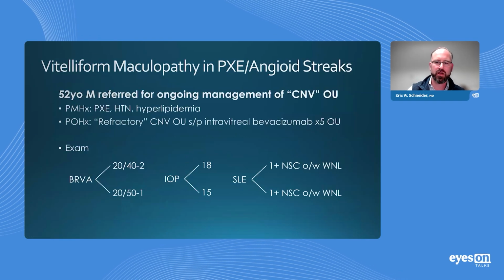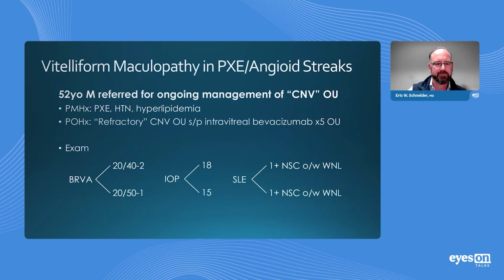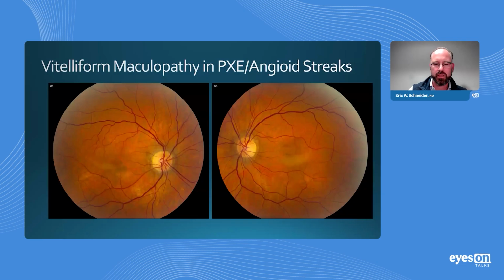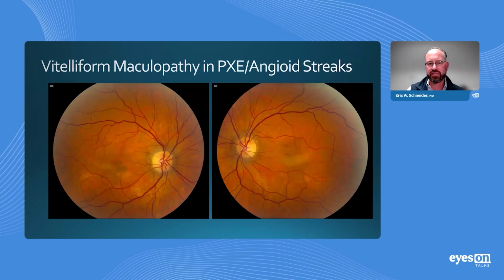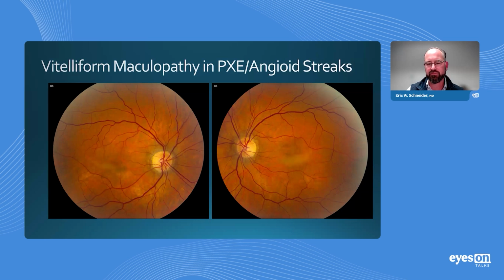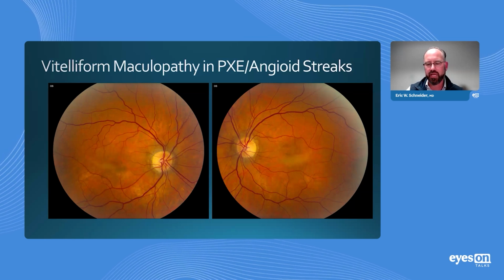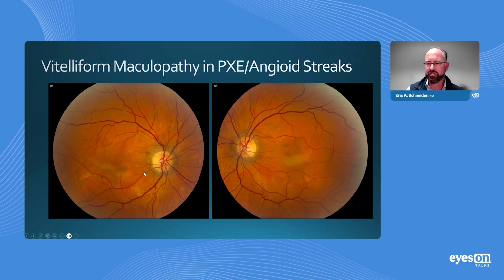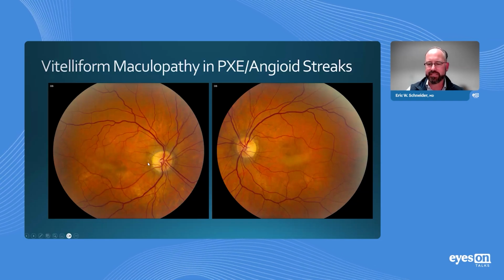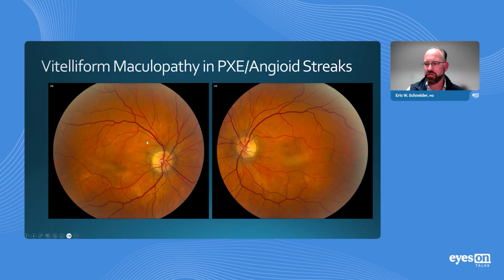I'm going to start over from the photograph because I forgot to mention the angioid streaks, which is really key. I apologize. And go. If we look at the color fundus photographs, we see these very interesting appearing vitelliform lesions with dependent vitelliform debris present inferiorly in both maculas with some associated RPE changes. I also want to highlight these circumpapillary angioid streaks with radiations extending from the nerve.